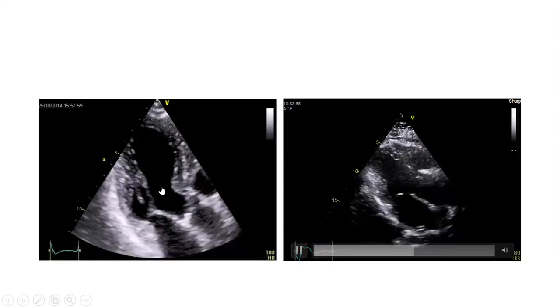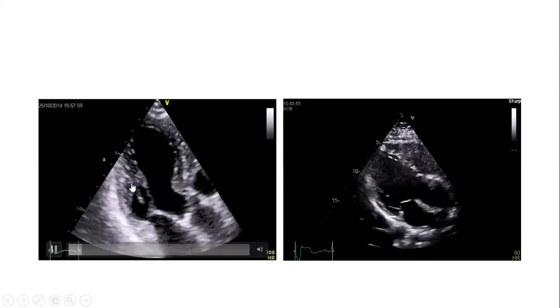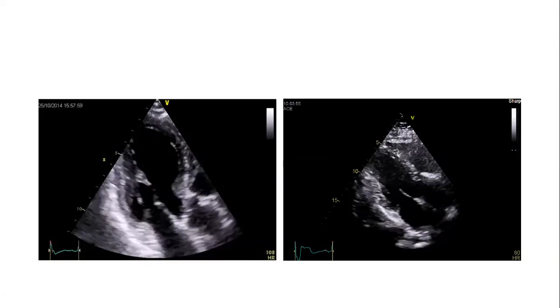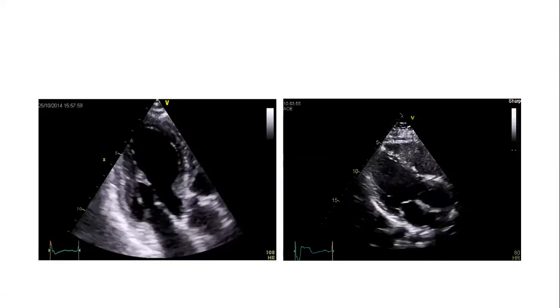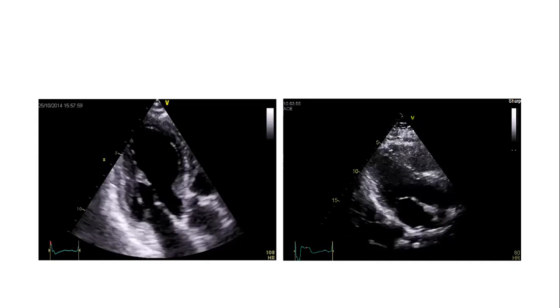This is posterior wall, this is inferior wall. If you happen to see a papillary muscle, that is inferior wall, not posterior wall. Then what should I do to watch posterior wall in plax view, sir? If papillary muscle is seen, manipulate your transducer in such a fashion that this inferior wall becomes posterior wall.